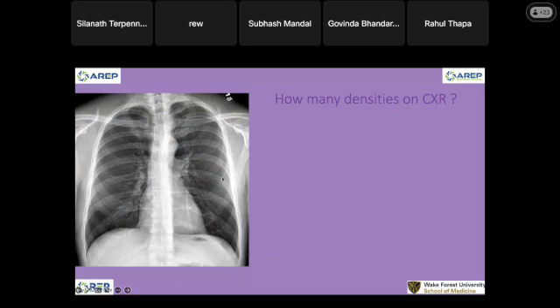Okay. Number one, do we know what this structure is? Number two, I have the next one. This density here, looking at the venous structure here between the intercostal spaces, in between the ribs. We're talking about the density of this.